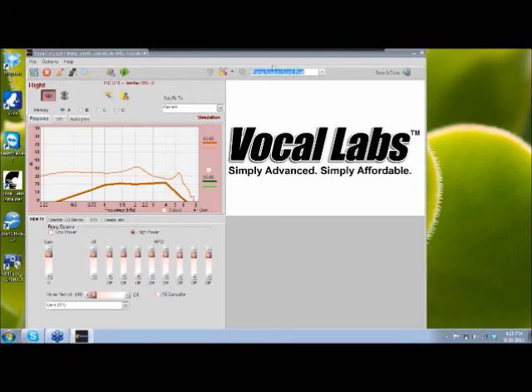Okay, you'll see these fitting adaptation levels up here. Some people like to have specified steps to raise their patient up. This will not change automatically in the patient's ear. You actually have to make the changes. And every one of these steps, if you start on initial, what happens is when you pick the adaptation level, you'll see down here, this thick solid line is the target line. And the thin line that you see there is the actual response of the hearing aid.